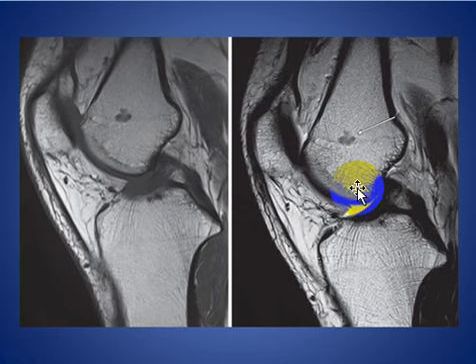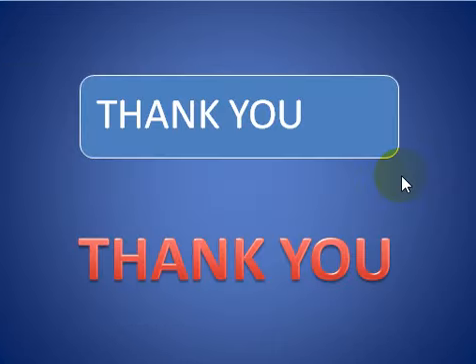Here, this is a patient with T1 and T2 images, sagittal view. We see here low signal intensity in the distal femur on T1 and T2, lobulated, and this is a bone island or enostosis involving the distal femur.